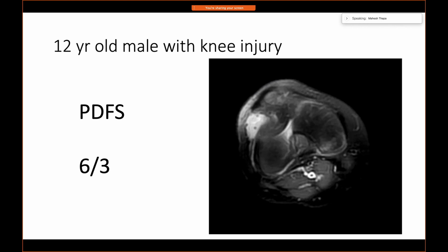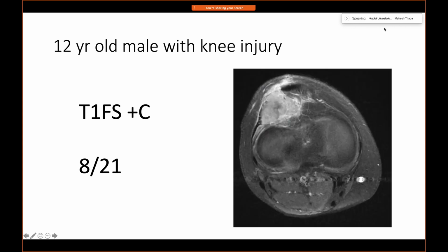So on June 3rd, again, they said, let's watch it. Maybe it's a vascular anomaly, vascular malformation, but it was behaving a little funny. And finally, we had them come to Children's, and at this point we said, well, this looks really funny. Let's give contrast. We have this T1 fat sat post contrast and a more aggressive looking lesion. So almost a year later, this is biopsied.